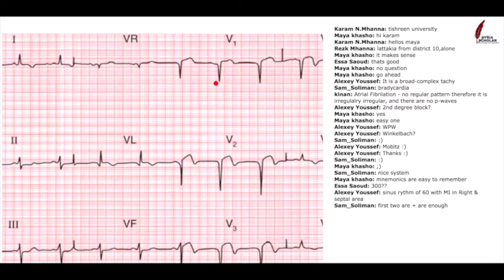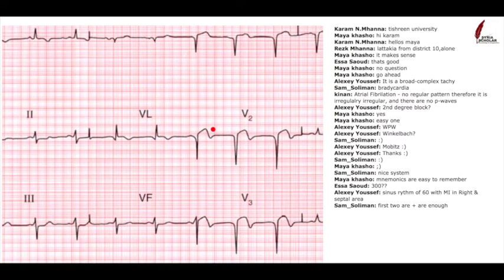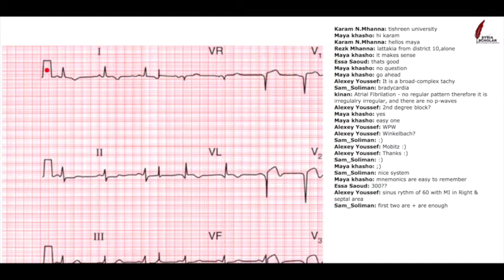So let's pick here to start with. You can see this is what we call the isoelectric line. This is the kind of level that the heart trace is sitting at. You can mark it from this marker voltage. This is just the calibration voltage that the machine makes. This is produced by the machine before it starts the trace. And you can see that its 0 point is around here. So this is where it's saying is 0.